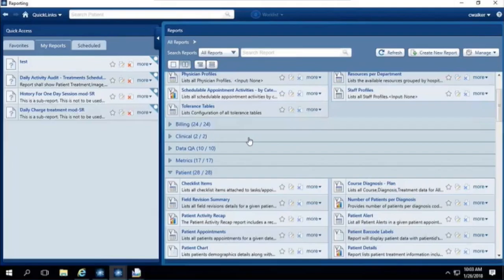All right. So at this point, my main goal is to show you a little bit more of what you can do with Aura. I know everybody's at least experienced Aura somewhat or heard of it. And we know that we can do a lot of features in Aura as far as scheduling reports and making reports and saving them as favorites. But I wanted to get more into the details of how I can simply take a report that I have currently and edit that, or even one step further, how I can create one from scratch and have it be a benefit to my department? So that's the main goal.